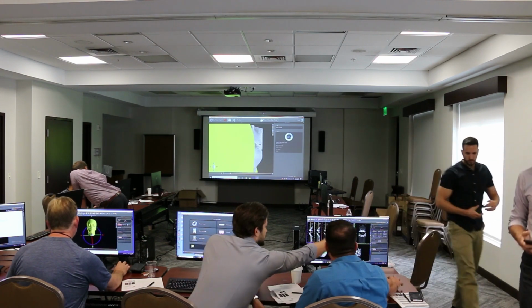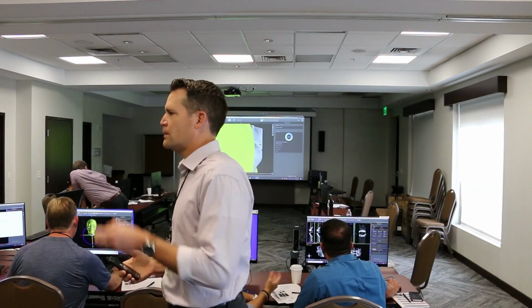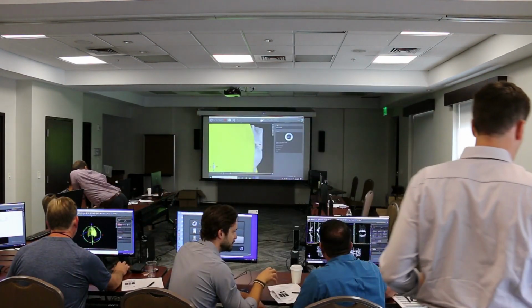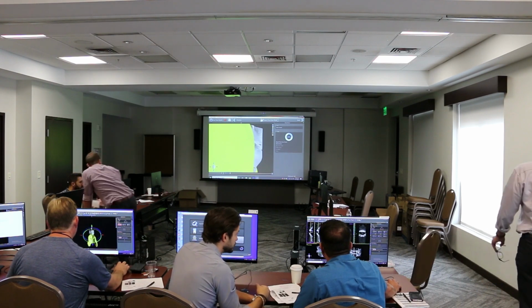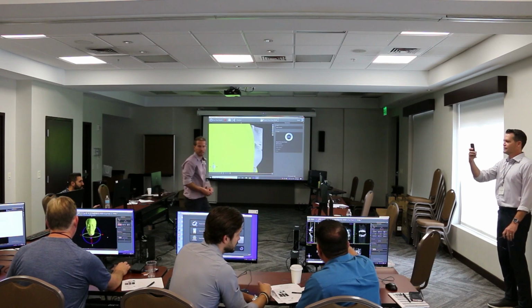You manipulate it with the wheel to see this cross section. You're basically seeing if it anneals everywhere. You're basically seeing if it grabs the model everywhere you want it to grab the model. And in your case, that looks pretty darn close, right? Yeah, of course.